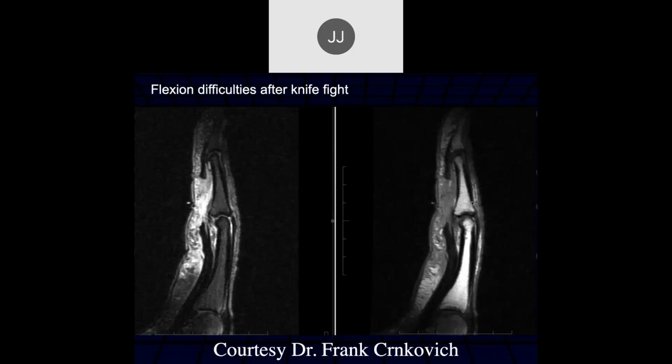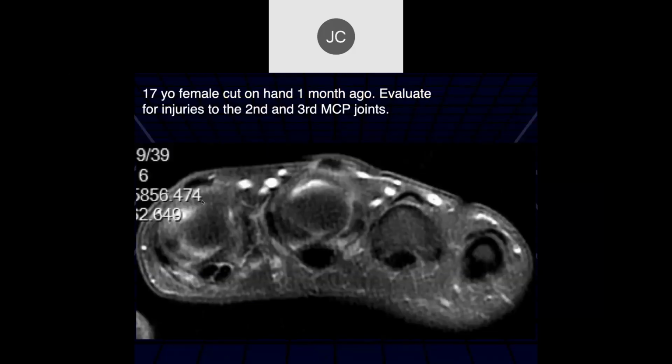So flexion difficulties after a knife fight, we see a tear and retraction of that deep flexor tendon. Not fixable.